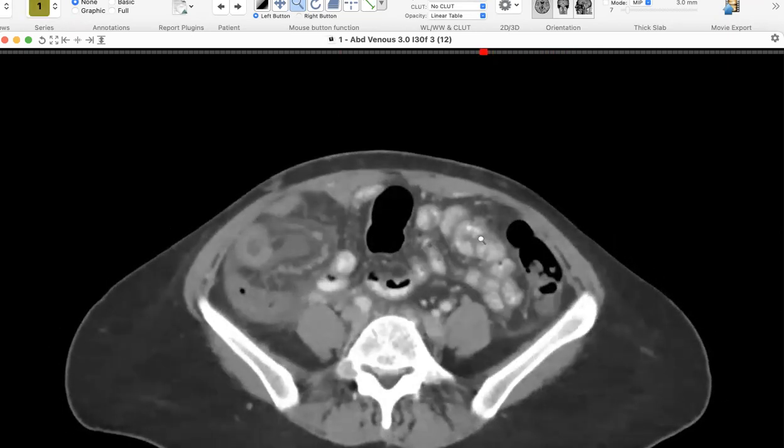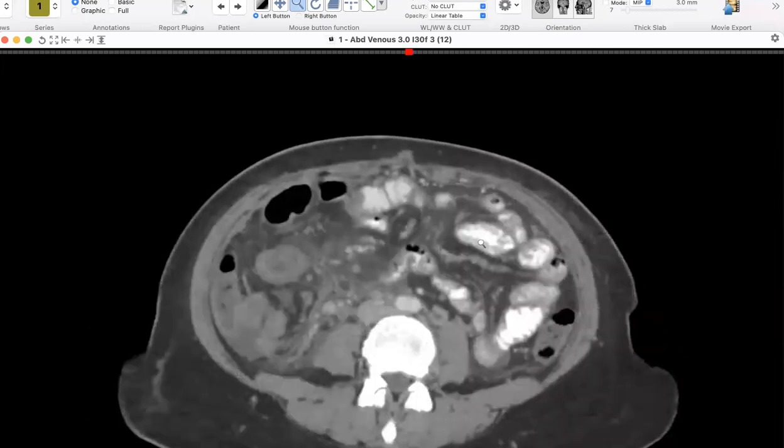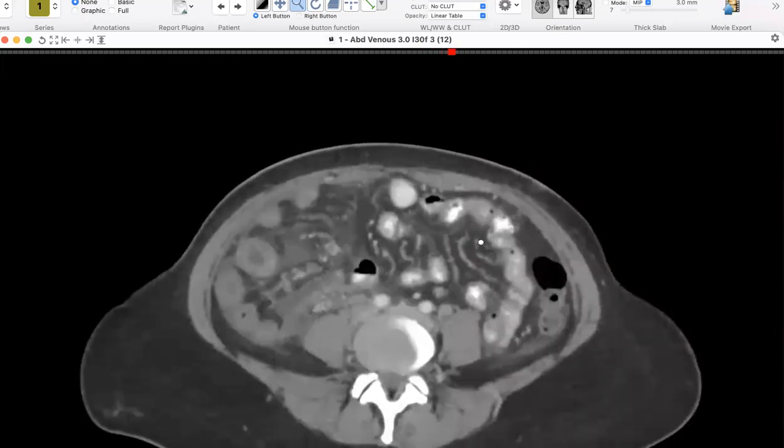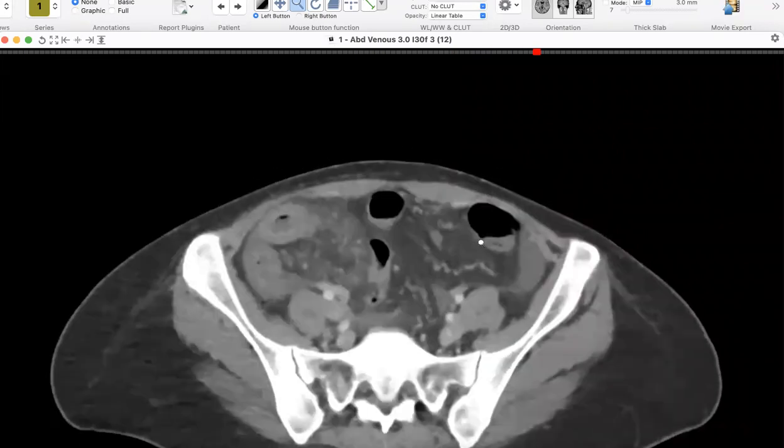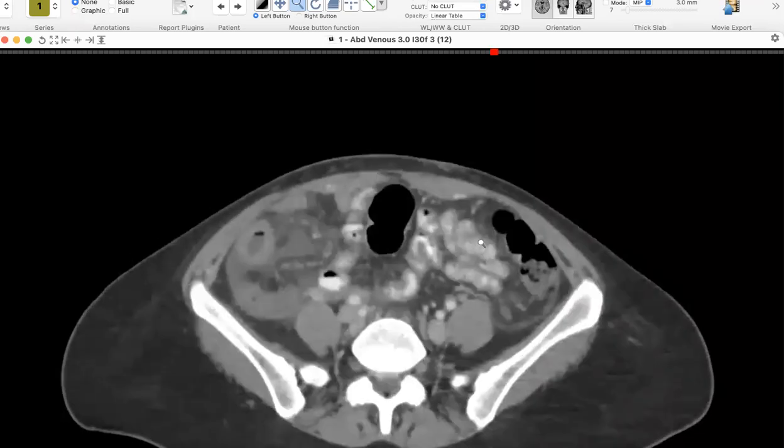Okay. Yeah. Do we still have time, Dr. Asad? We are left with 40 seconds only. Okay, so I'll give you 40 seconds more, Dr. Walid, because you didn't read the diagnosis in this one. Can you see something else? Any other thing coming to your mind?